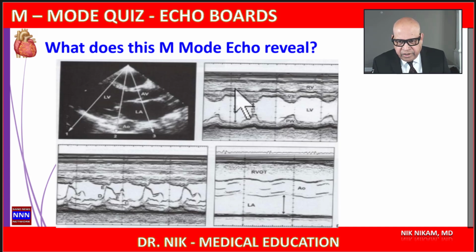Here we can look at the thickness of the interventricular septum, the end diastolic and end systolic diameters, the thickness of the posterior wall, the thickness of the pericardium, any evidence of a pericardial effusion either in the posterior region or in the front, a whole host of things that can be evaluated in these.